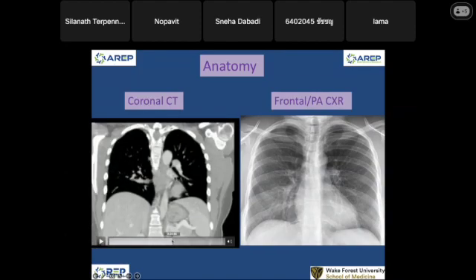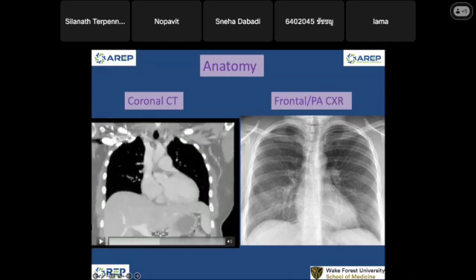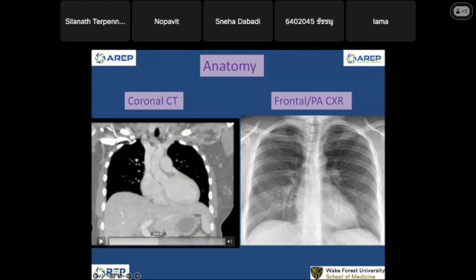Okay, so we're done with the soft tissue and the bone. Now we're going to go further into the chest. We're going to see the contrast. This is CT chest with contrast, so you start seeing bright contrast in the vascular structures and the heart here. We injected the contrast from the right upper extremity, and the contrast is coming through here.